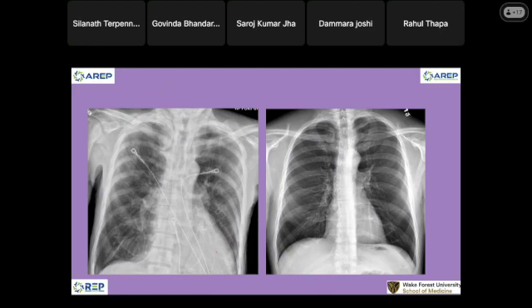So in that case, I would say go back to the patient and come back to chest radiograph again. If the chest radiograph is better, okay. If the chest radiograph looks like symptom is getting better, but the chest radiograph looks a bit bad, or even worse, we cannot leave that alone. I'm not satisfied. So he may have a little bit of pulmonary edema. Because after the treatment the pulmonary vasculature looks prominent here and there. It still looks busy everywhere. I will ask to do CT.